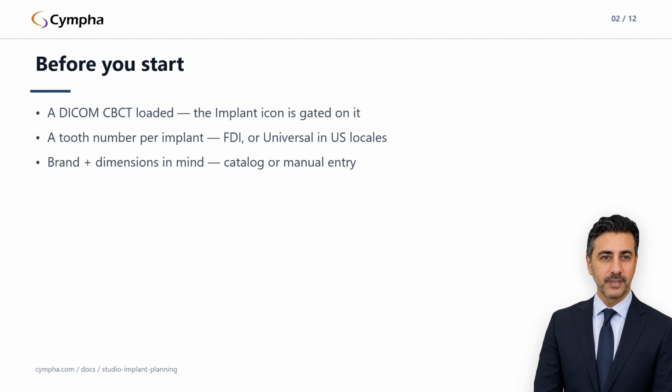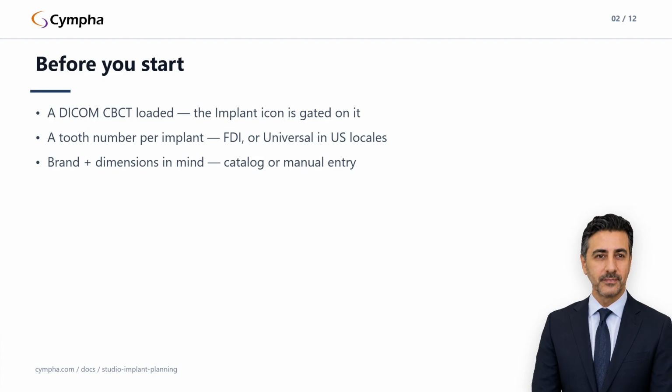If the scan lives in your Cympha cloud, open it into Studio first. If it's local, the hamburger menu's Open DICOM action brings it in. Second, have a tooth number in mind for each implant you plan to place. Studio's tooth numbering follows the FDI system, except in US locales, where universal numbering is used, so what you type depends on where you are.